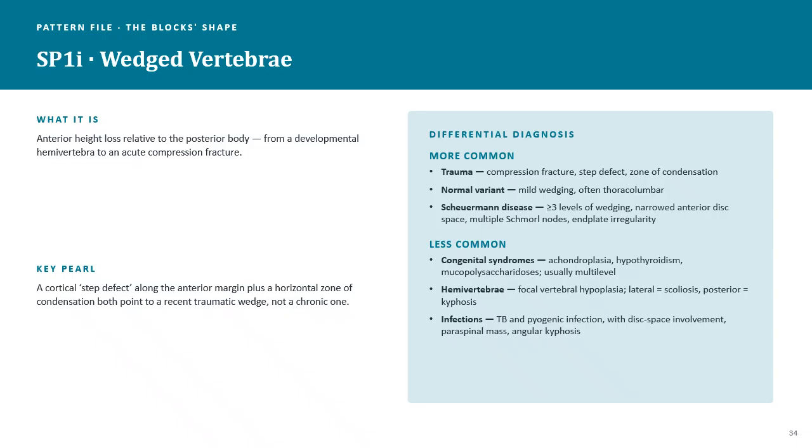When we have wedging, usually the front of the vertebrae loses some of its height and the back of the vertebrae stays a lot taller, or its proper height. So instead of appearing normal, it has a wedge appearance. If you've ever seen a doorstop that looks somewhat like a triangle, that's what we're talking about with the wedged appearance.